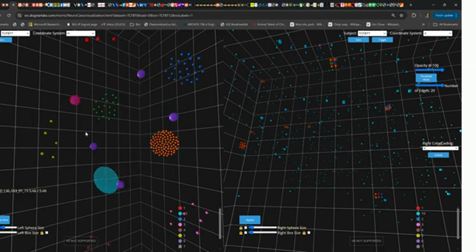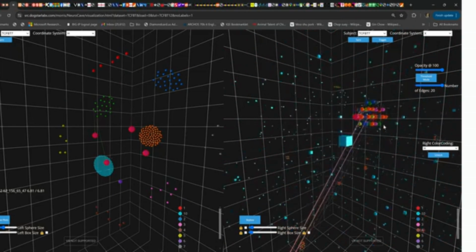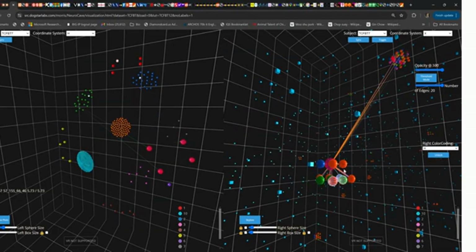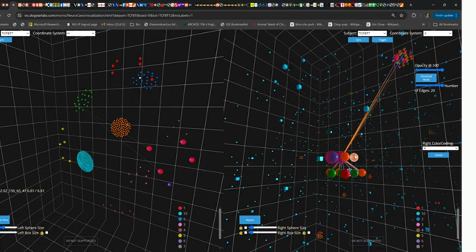And so you can click on all of these cluster members and see which anatomical regions they're targeting there. It seems like only these two tumors are involved in those clusters. So we can hover around one tumor and see which clusters are contained in it, and the other tumor. And we can click on various nodes in the tumor and see which clusters they're connected to.